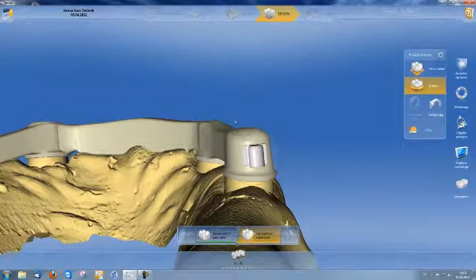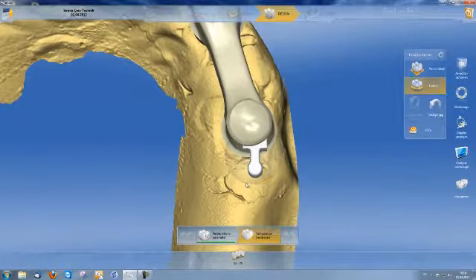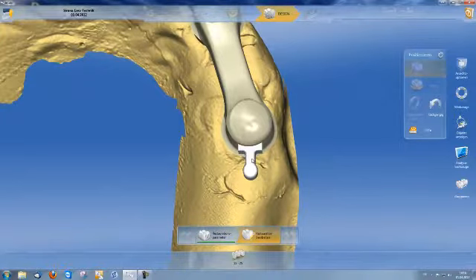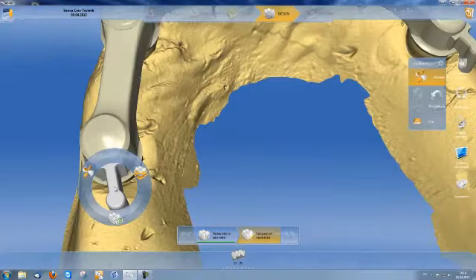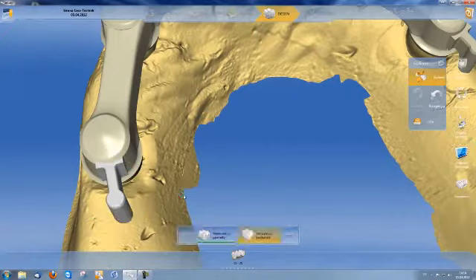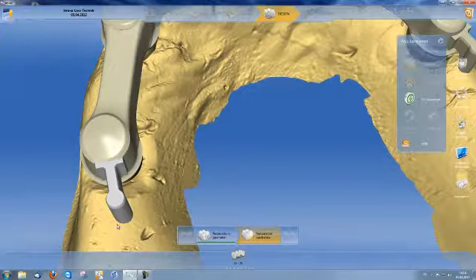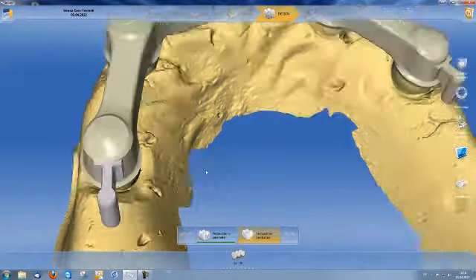However, I must take care here. If I move it into my axis, I lose my telescope angle, and thus I only rotate it. I move it in slightly, and also do the same on the other side. If the attachment has changed completely, for example, it is possibly outside of the telescope angle, I would now have the chance to click on Recalculate, and the attachment would be aligned again according to the first proposal.